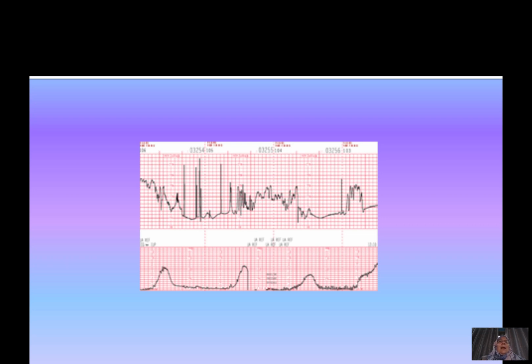Okay, so first of all, you look at the contractions, and you can see that this patient has contractions. It looks that they are 2 to 3 in 10 minutes. Then you look at the fetal heart rate trace, and you see a baseline which is normal. Now here I want you not to be fooled. The baseline is around 120.